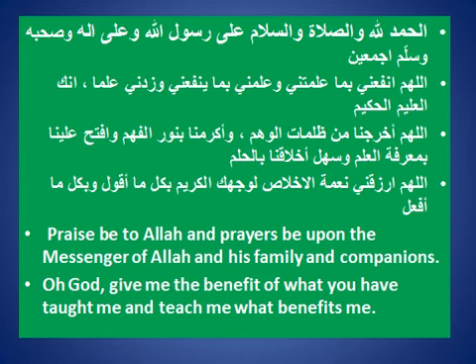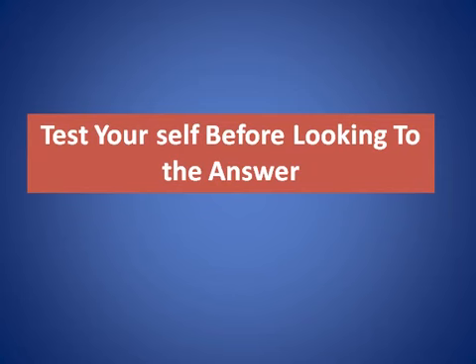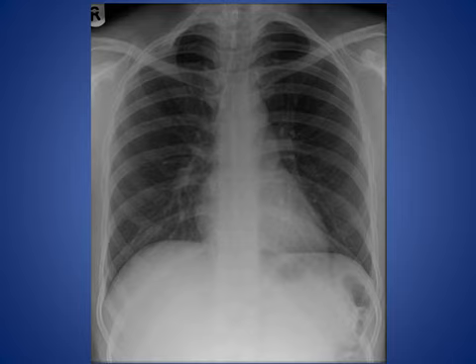My topic today is about presenting 10 cases of chest X-ray, and I hope you try to test yourself before I give the answer to these chest X-rays. The first case, try to look at it and try to find what is the pathology.